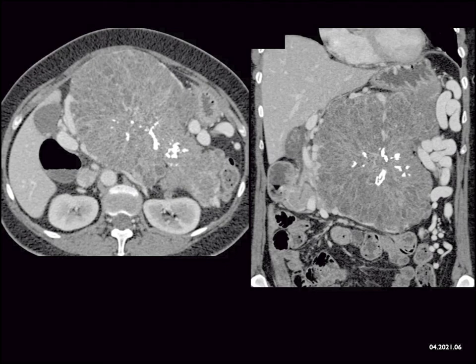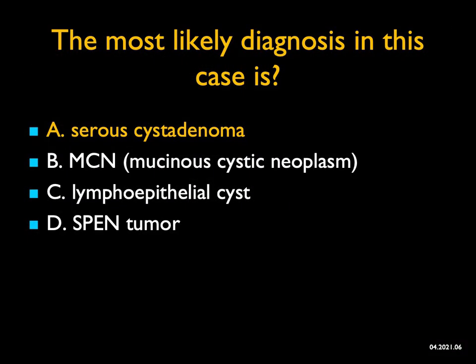Serous cystadenomas and serous cystadenocarcinomas are really very, very good possibilities. Serous cystadenoma typically will give very nice stellate calcifications centrally in the lesion, and that indeed is the case here. Serous cystadenomas are benign lesions, but they can be causing mass effect, and so once they're over 5 cm, surgeons will typically resect them.